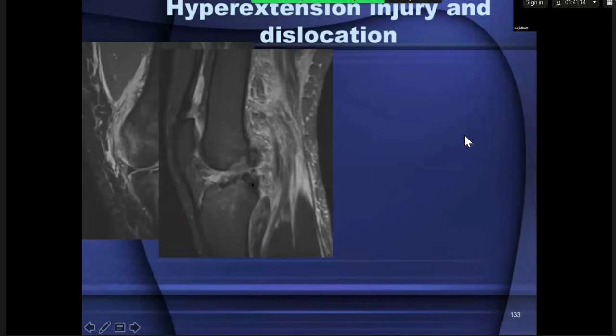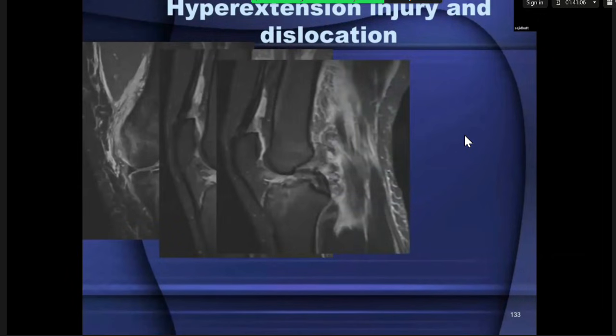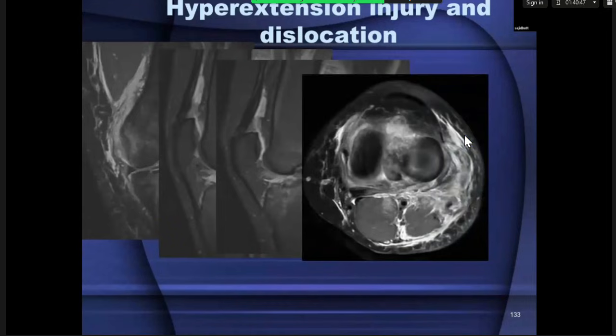These are the exam cases that we know have been asked about in FRCR 2B. So be prepared, don't get overawed. Stick to the rules that I've tried to describe in my coverage of the knee. Stick to the two structure analogy that we've used. Look at the medial and the lateral. Look at the anterior and the posterior. Look at the quadriceps tendon and ligamentum patellae. And you'll get them all in the end. So notice how extensive the injury to the posterior knee capsule is here. You've got injury present of the posteromedial and the posterolateral corners, extensive edema present to the front.